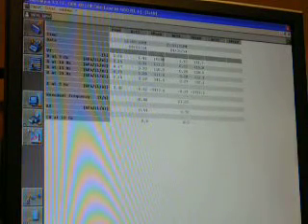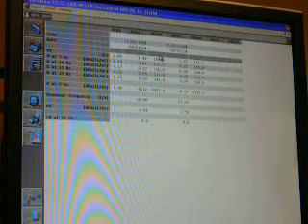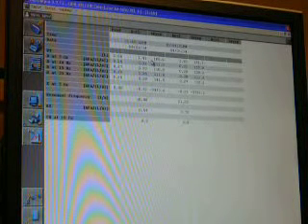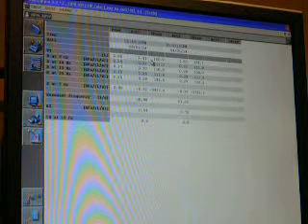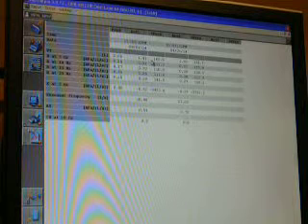Remember, we're not interested in predicted values. For this protocol, we're just interested in the raw data. And we want to see if this was truly an acceptable maneuver. We have a couple of ways of doing that. We want to look at the values.